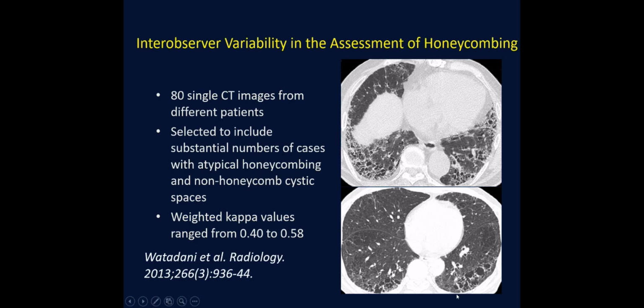Here's a patient with unusual cysts that are not subpleural and relatively large. We often see this sort of finding in cigarette smokers. Very difficult in some cases to distinguish from true honeycombing.